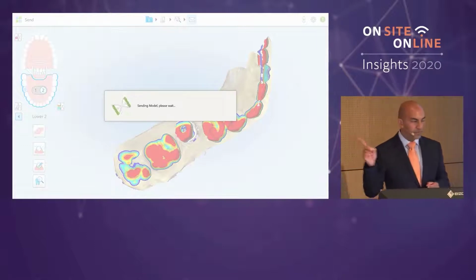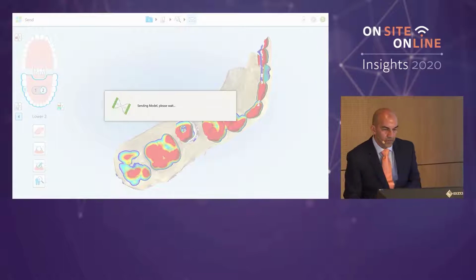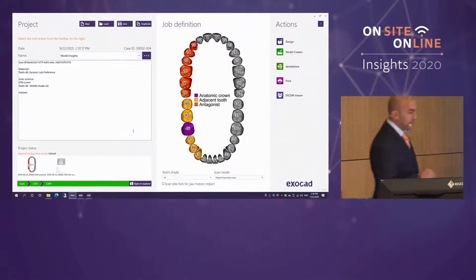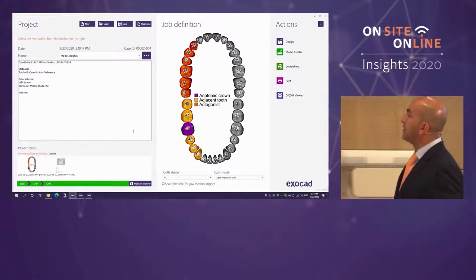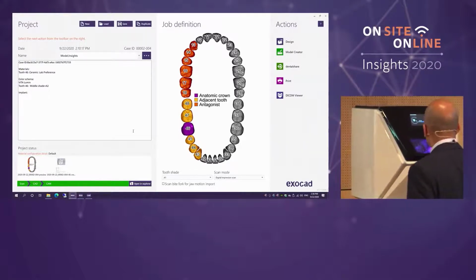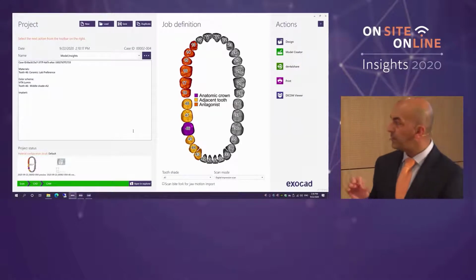So currently, post-processing is going on the machine. It's sending the model data across. Let's have a look at how our milling machine is going. So 25 minutes done. It actually looks like a crown now, and it's doing the detail.